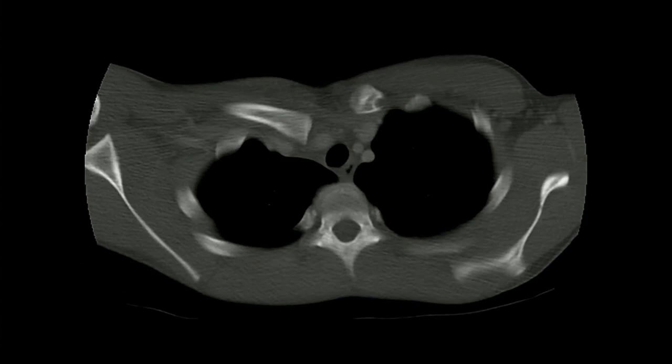Well, I would recommend a CTA, and we'll go into the findings in just a minute. But this is in bone windows, but you can see that we do have opacification of the vessels. But look at the positioning of the clavicular heads. So obviously there is a discrepancy in the positioning, and this is important because you now have to decide which one is normal, which one is not.